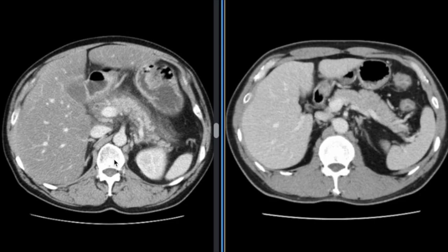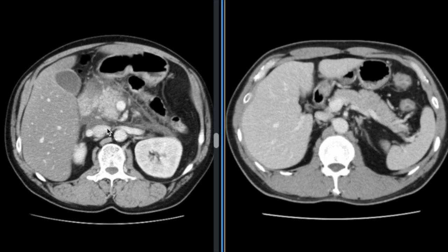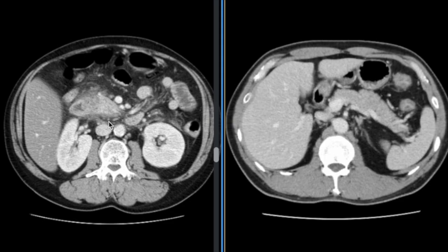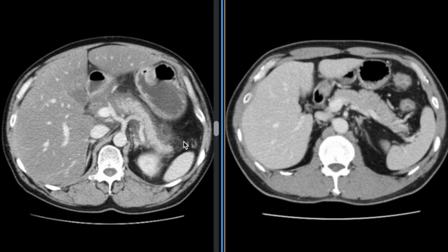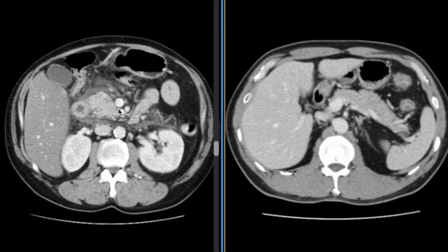In contrast, the pancreatitis image shows elevated signals around the organ reflecting inflammation, and there's fluid accumulation. Inflammation causes the pancreas to swell and partially liquefy, so the granular contour becomes less distinct. Seeing them side by side makes the differences easy to appreciate. In this case, the changes aren't extremely dramatic, but in some patients, the pancreas swells more or the granular texture disappears entirely. Those findings also suggest pancreatitis.